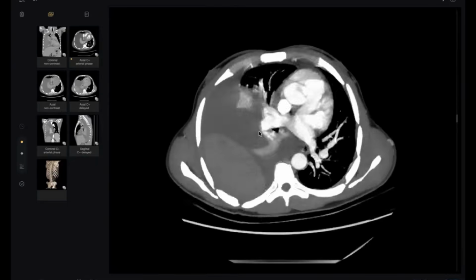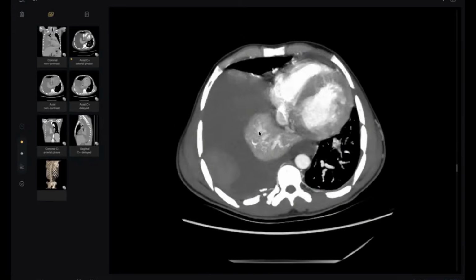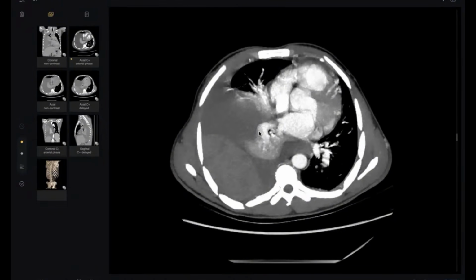If you drain, you will see. But you gave me a very excellent diagnosis. This is a hematoma and bleeding. So, next step, do you prefer to drain now or not? And if you prefer, what is the correct location for the catheter?